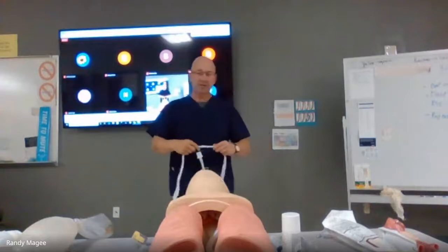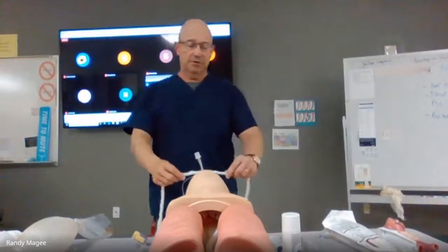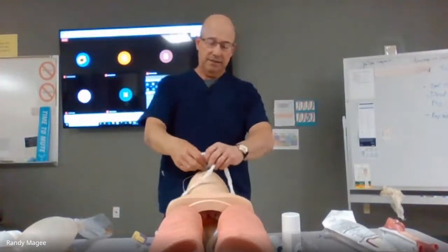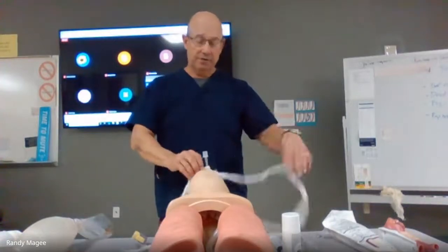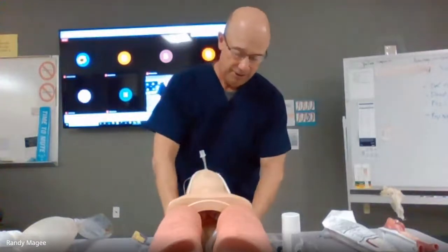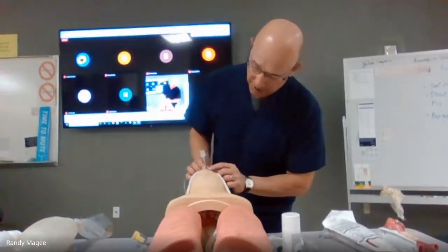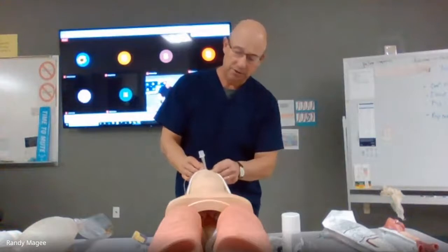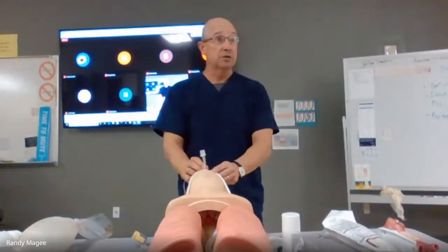And this is something we'll practice a little bit. Mainly, I want you guys to practice using the bag valve mask with this. Then you have some sort of device to secure it. So I would secure it around the neck like so. And then I would mark where that endotracheal tube is. It's marked off in centimeters. So I would mark that, and that way if this tube moves, then I know it.